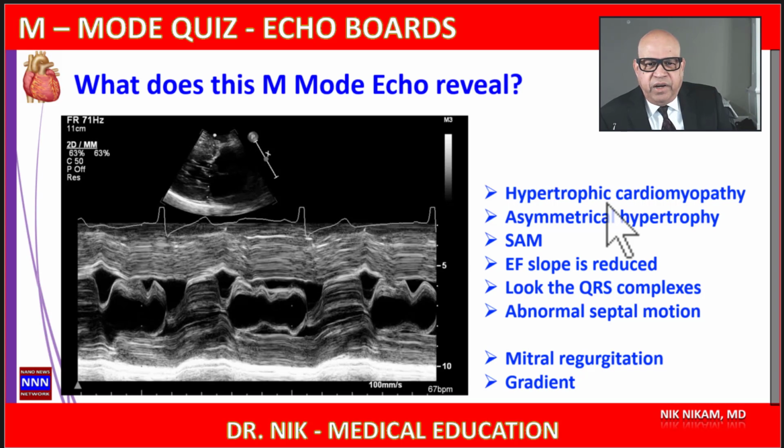Echocardiograms are extremely useful in identifying patients with hypertrophic cardiomyopathy and also in terms of timing of the various abnormalities associated with it. In this patient, we have an abnormally increased thickness of the interventricular septum compared to that of the posterior wall of the left ventricle, and along with that we have reduced septal motion plus anterior motion of the anterior leaflet, which is called the systolic anterior motion or SAM, which almost abuts the septal wall during systole.